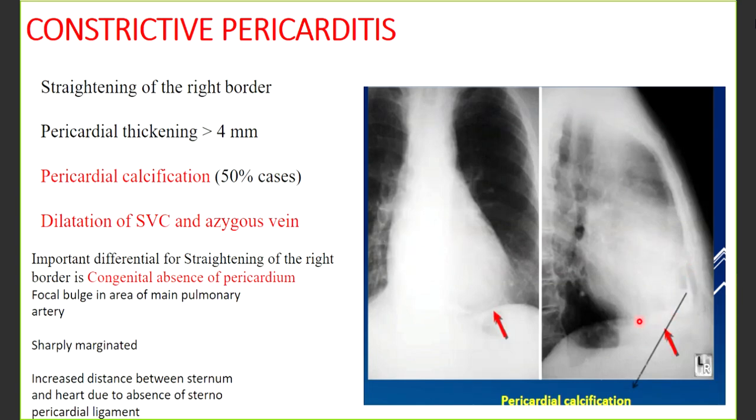To diagnose constrictive pericarditis by X-ray, it is very important that you take both PA and lateral views, because sometimes if you take only a PA view, a previous MI with calcified LV aneurysm may also show evidence of calcium, but we can confirm that it is along the pericardial border in lateral view, not in the ventricular myocardium. It is very commonly identified on fluoroscopy because you can see the calcified pericardium is immobile whereas the heart is in constant motion.